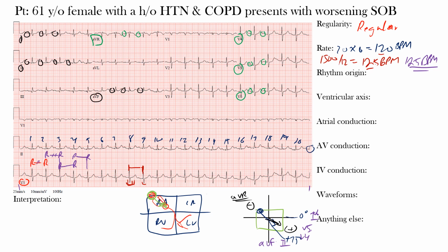And remember, with sinus rhythm we want a P wave coming before each QRS complex. So each P wave comes before it, and we see that here, and there should be one P wave for every QRS complex. What we mean here, just erase that so you can see this: this is a P wave, this is a QRS complex, P wave, QRS complex, P wave, QRS complex. There's one P wave for each QRS complex. Because we met all that criteria, we can in fact say that we are dealing with a rhythm that originates from the sinus node.